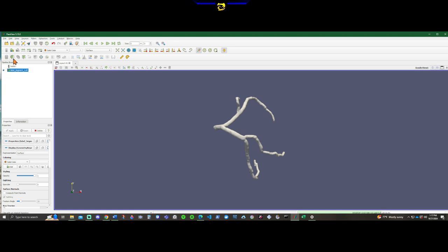And in here, we're going to be essentially clipping off the ends, and it's not a very simple process. Well, it's simple, but it's a very tedious process, and I wish I knew the ways of making this process less tedious, but we're working with what we have.